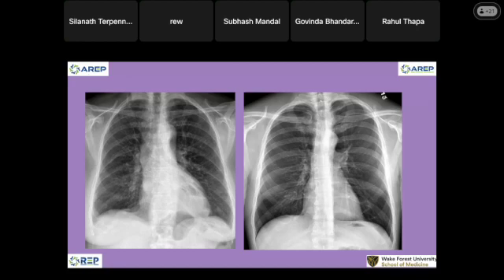It's coming down and connecting here, up here, and then look at it. See that? It's coming up here and then it's going down. You can't see the pericardial here on chest radiograph. You can see it on CT. Normally, the aorta should be on the back side of the body, on the left of the spine, not on the right.